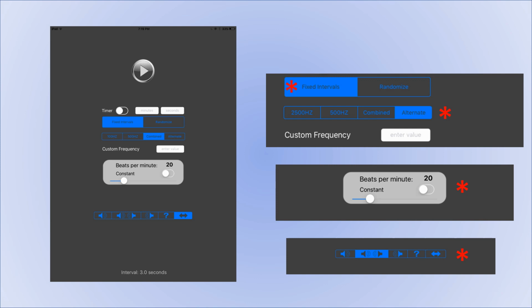On the third image, the bottom image to the right here, this is your headphone setup. You can see that both ears are highlighted. So that bar from left to right, if you highlight the first box there, first speaker, it will play just in the left ear.